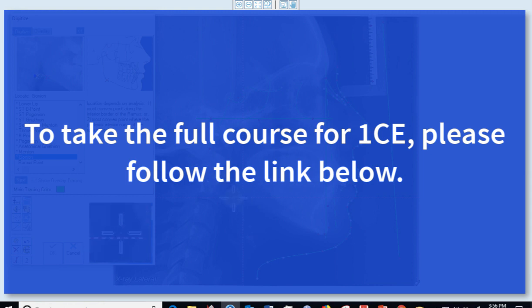So some people would put gonion here, or you could use the most convex point along the inferior border of the ramus. I tend to use constructed gonion, where you follow the mandibular plane and the posterior part of the ramus, and that's your constructed gonion.